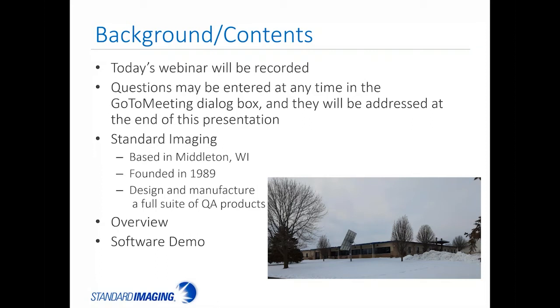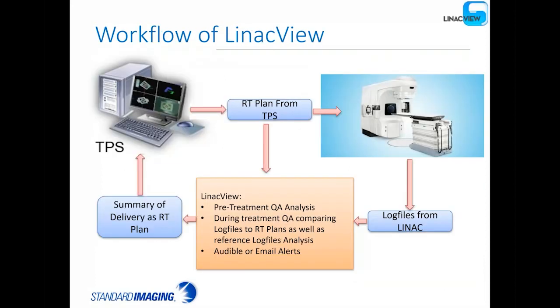I'll give you a brief overview of LinacView, and then I'll do a brief software demo. To begin with, I'll go through the workflow of LinacView. One would start with your treatment planning system, do an RT plan export through your record and verify to the Linac, and at the same time, do an export of the RT plan to LinacView.